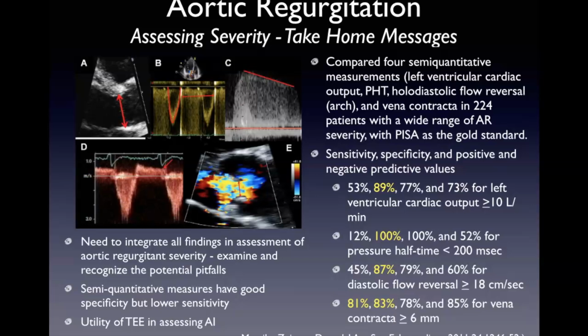The caveat is that contrast gives you better EF assessments. It gives you better volume assessments, but all the normal values we have are for non-contrast. So we have to recognize that contrast volumes in normal patients are greater. We're trying to get more data as to what those normal values are for contrast. But volume and EF assessment in chronic severe regurgitation, whether it's MR or AI, are important because that drives intervention even though patients are asymptomatic. Which is one of the reasons why Jeremy talks about getting LVEF assessment with contrast in MR more than any of the other lesions. So it is important.